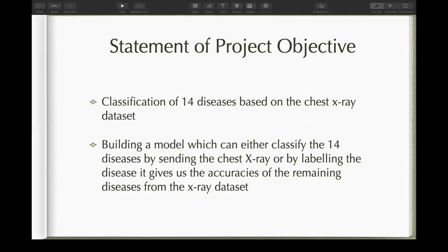We get the chest x-rays, reviewing how many cases would be under the named label disease. There are 14 diseases, but the classification is done in 15 classes, because we take no disease as one of the classes. This is a famous paper implementation, which is also known as CheXNet. So we are re-implementing the research paper. Our project is a re-implementation of that project.